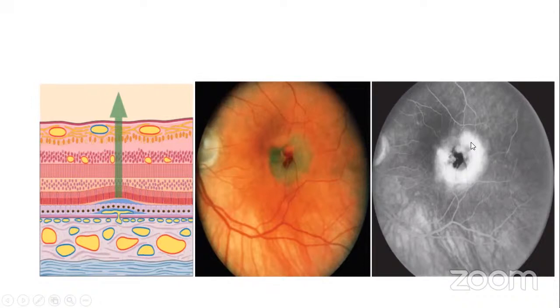But see the abnormality here. So you have this hollow or halo-like hyperfluorescence around the macula, the central part of which is hypofluorescence. So you describe, okay, there's a ring-shaped hollow-like hyperfluorescence around the macula that measures about a disc to a disc and a half in diameter, the central part of which is hypofluorescent. So from this, we can start thinking about what could cause this.